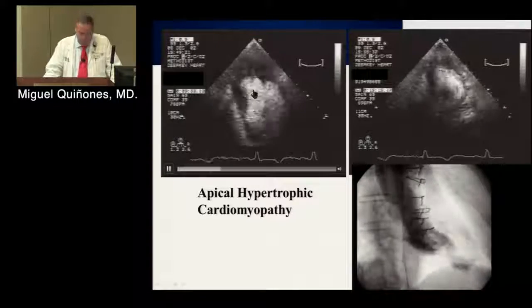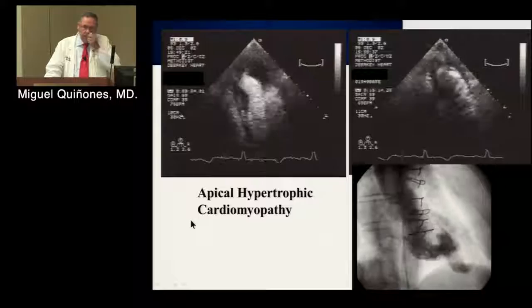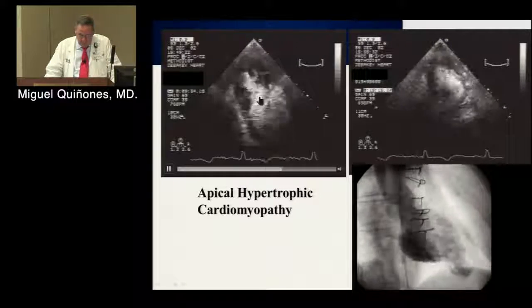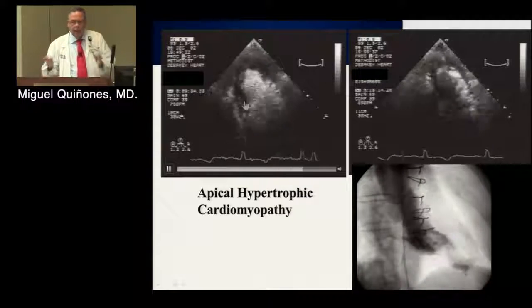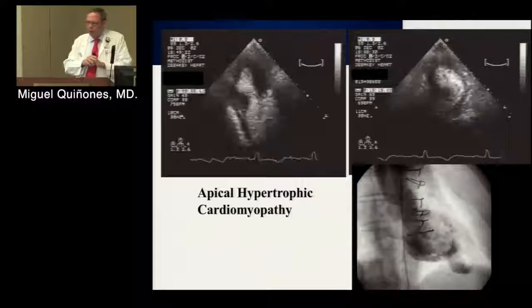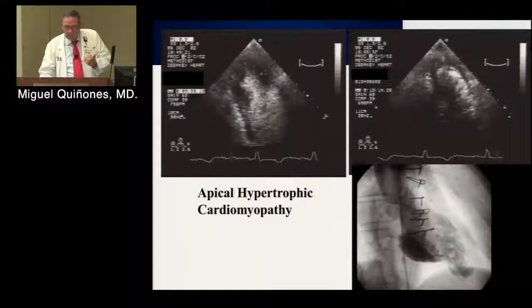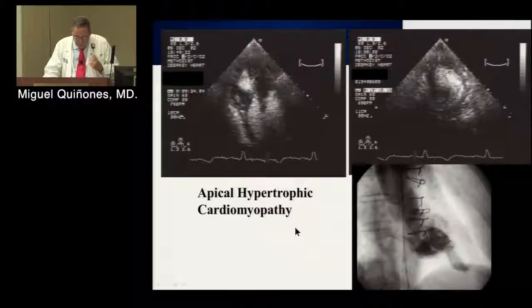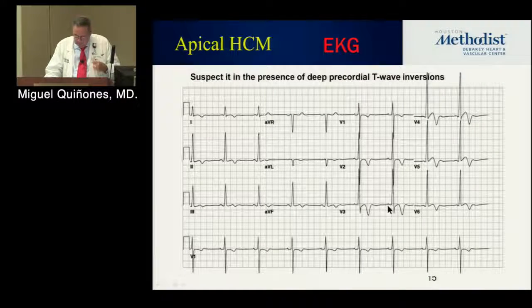So this is one situation where the contrast is very, very helpful because in apical views, the attenuation of the myocardium here can drop out the echoes, and you may go by the study and totally miss it. So you need some clues so you can get some contrast injected. Otherwise, the patient will be missed.